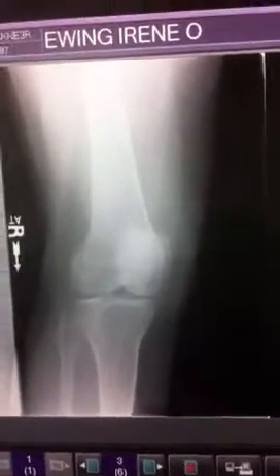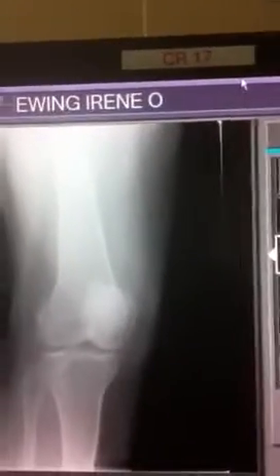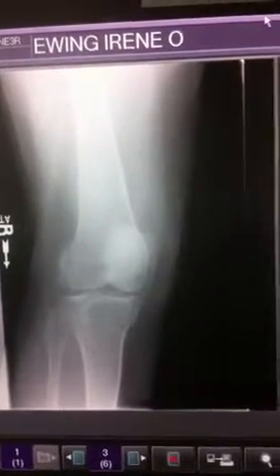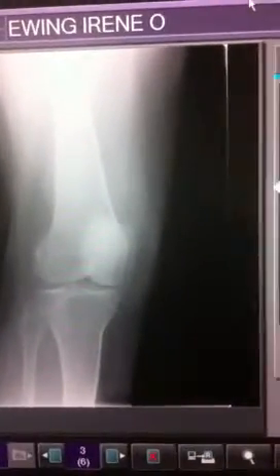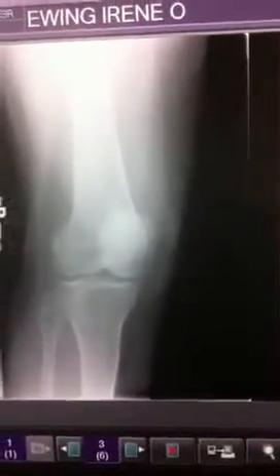Now for the internal oblique medial rotation, the tibia and fibula should be separated at their joint, and the lateral condyles of the femur and tibia should be visualized. The knee joint should be open. The medial margin of the patella should be projected slightly beyond the medial margin of the femur.